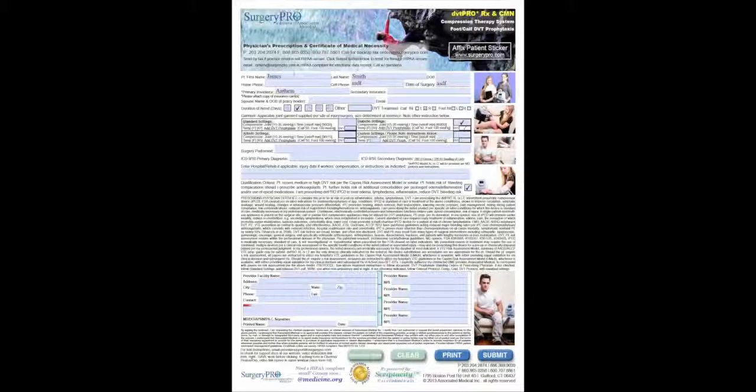Let's understand here that this document is in its natural state. I'm going to hit clear so you can see this. The natural or native state, standard settings, is pre-selected. DVT does need to be checked if you'd like to add DVT, and note that the pre-selected DVT function is bilateral, so you could select another one if you'd like. The timing is not pre-selected. You need to indicate which length of time.